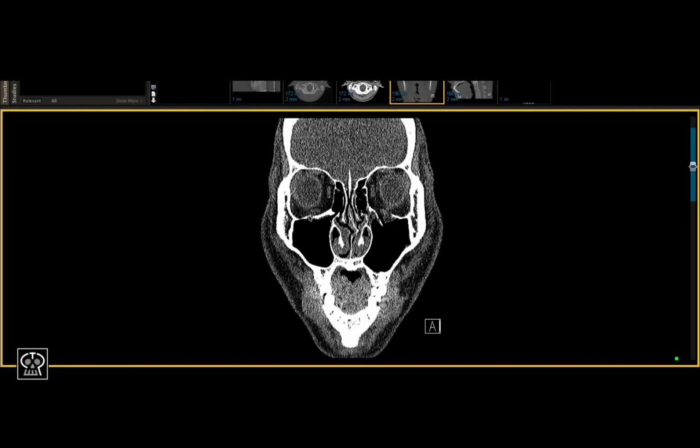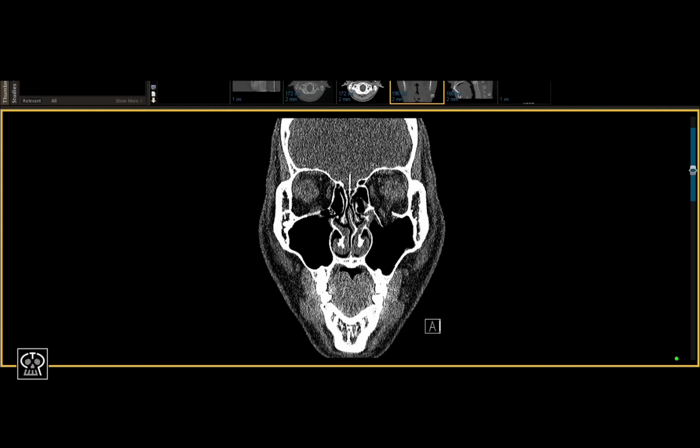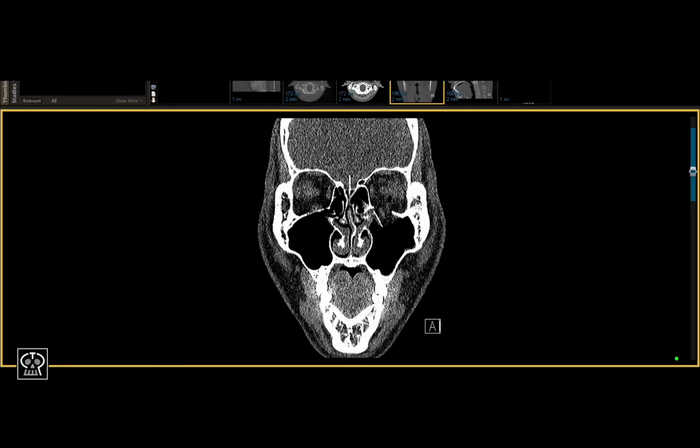Just to show you what it would look like on a normal side, on the right side, you always want to see your bone with no breaks or fractures, and a smooth muscle, usually oval in shape above the bone, with no entrapped portions in between.